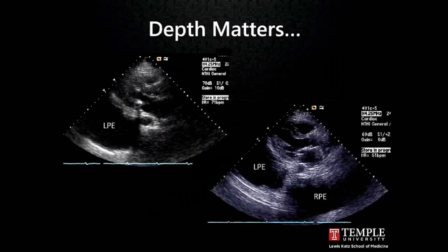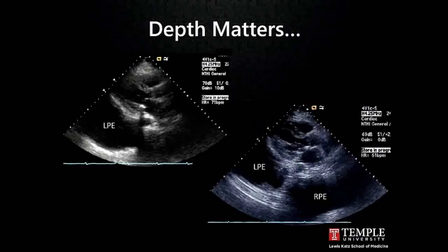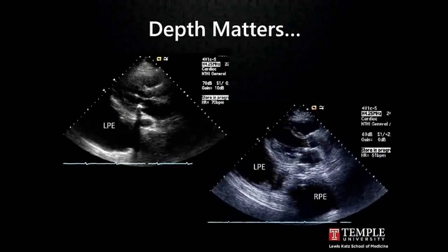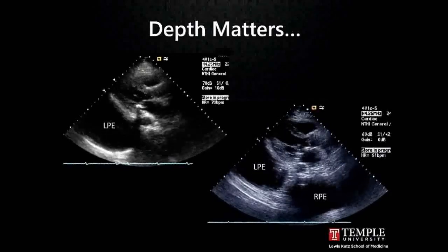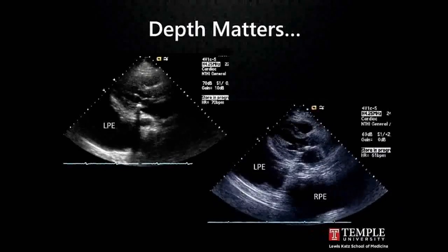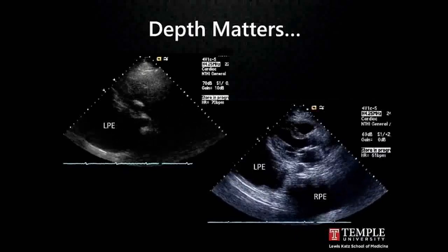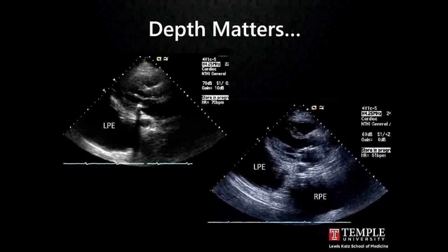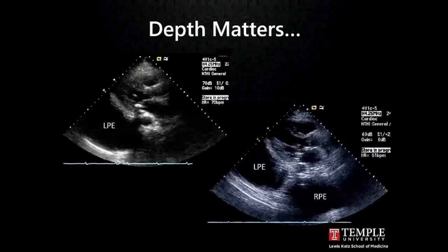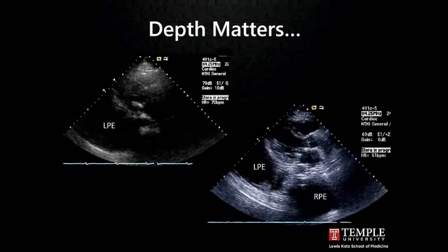Although we can take that initial view, and we use that often clinically to get a quick look at patients, if you look with depth, you can appreciate the depth of artifacts. You can also appreciate pathologies which exist at further ultrasound depths, like this left pleural effusion noted on the left part of the slide. It's sort of a coincidence because Dennis reviewed an exam question that highlighted a left pleural effusion, but it's certainly not inappropriate for showing up on your exam.